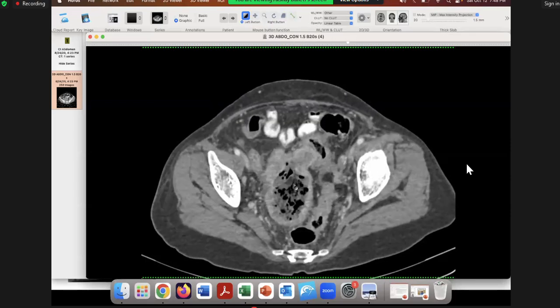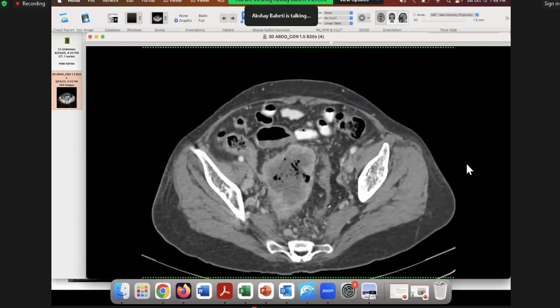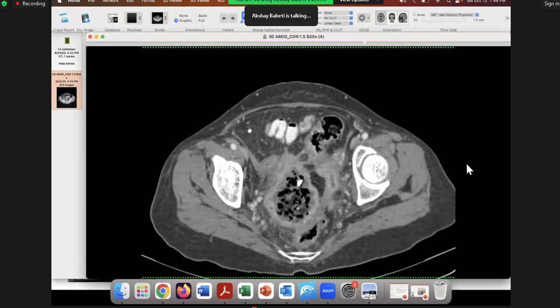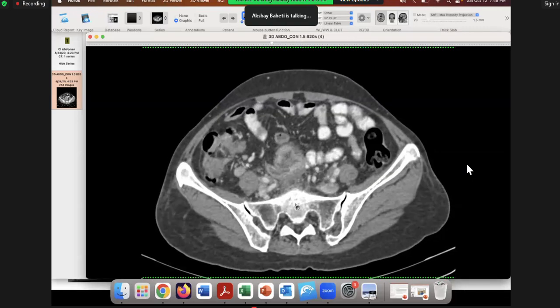It's something else. I agree, it looks like bowel, but whatever it is, it's not sigmoid. It may be some other bowel. It may be something else altogether, but it's not sigmoid. So we'll search where else it involves bowel, or where do you see something involving bowel? What do you see?